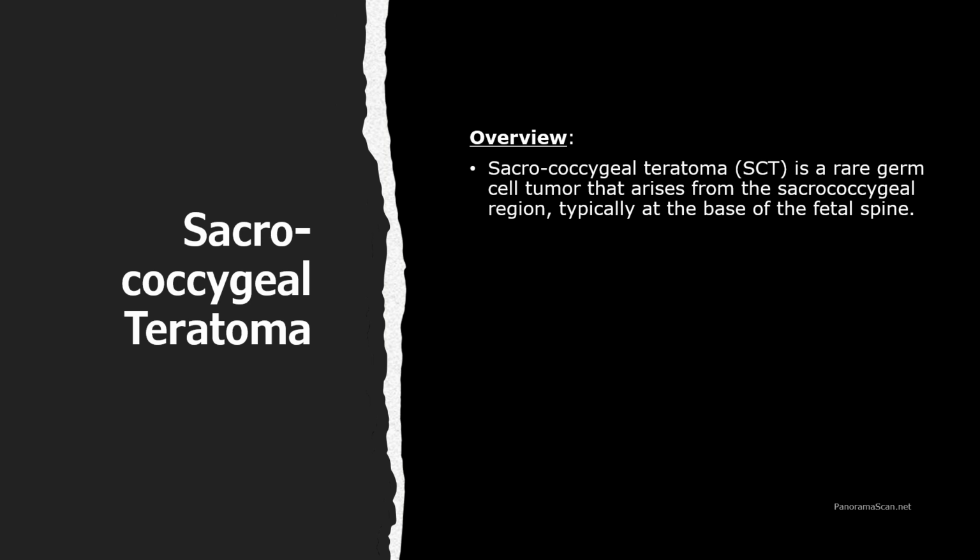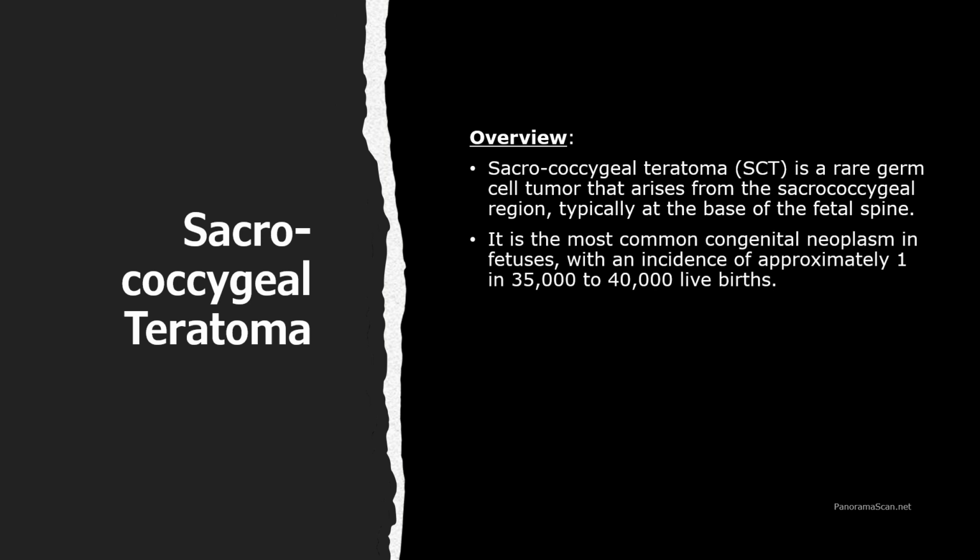Sacrococcygeal teratoma is a rare germ cell tumor that arises from the sacrococcygeal region, typically at the base of the fetal spine. It is the most common congenital neoplasm in fetuses, with an incidence of about 1 in 35,000 to 40,000 live births.